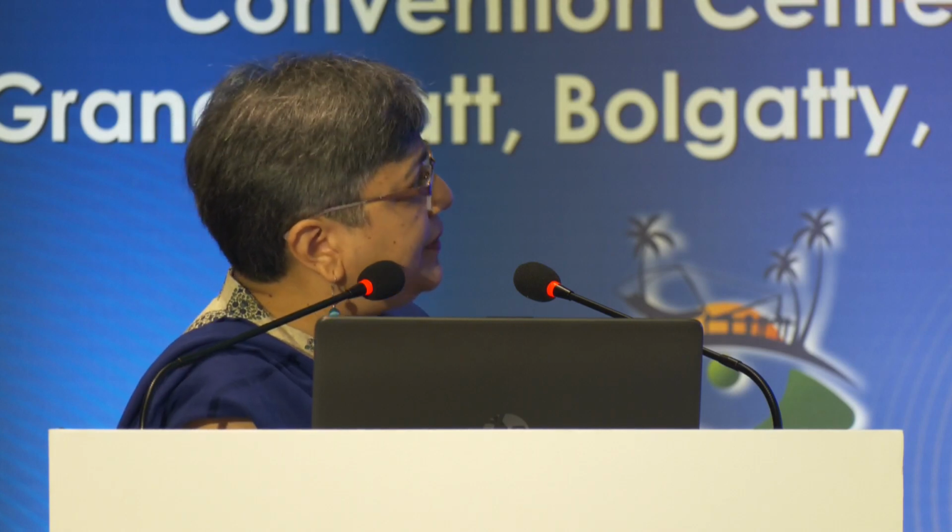Now, this again, right eye has glaucoma. There's no doubt about that. And even the left has glaucoma here. An early glaucoma and a central visual field defect, most likely normal tension glaucoma. But look at the OCT again.